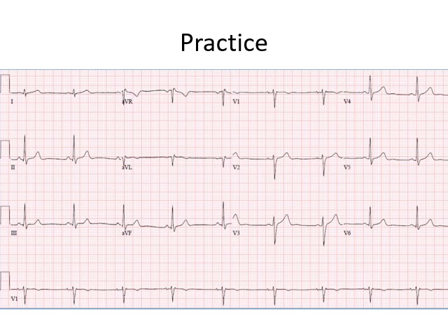Henceforth, whenever I say 1 second, it means that I am going to take a 1 second pause for you guys to interpret the ECG. So 1 second.